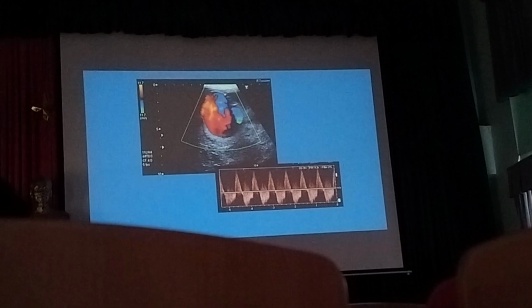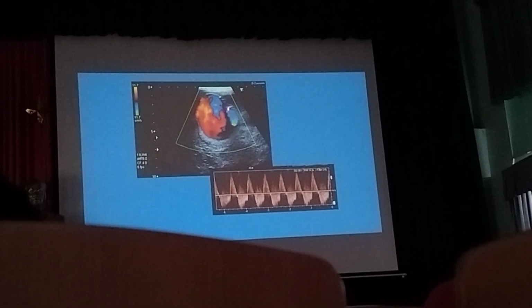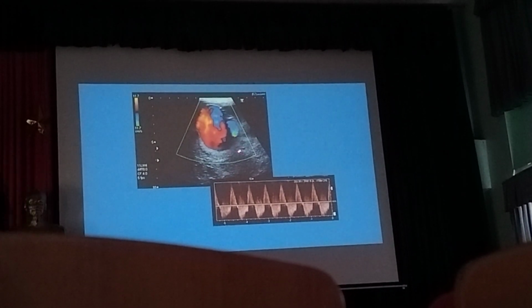So, and this is ultrasound that shows you that there is a flow inside the area of enhancement.